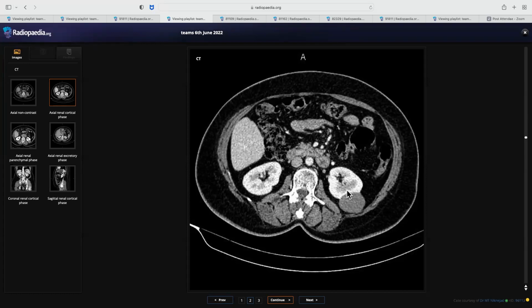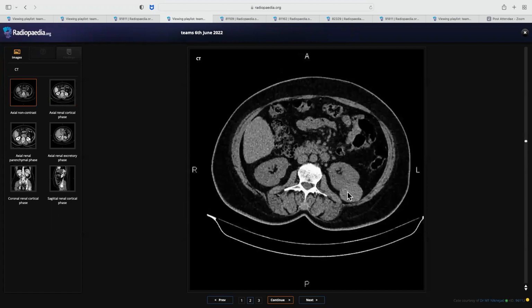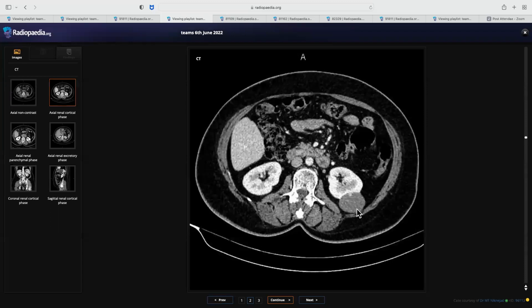But then again, I had to ask you, what is that? I mean, how do you classify that? Once you see that hyperdense lesion, hyperdense contents on plain, so that has to be a cyst with some hemorrhagic contents, because it's not a mass, it's already a hyperdense, non-enhancing kind of lesion, except that mural nodule which is enhancing.